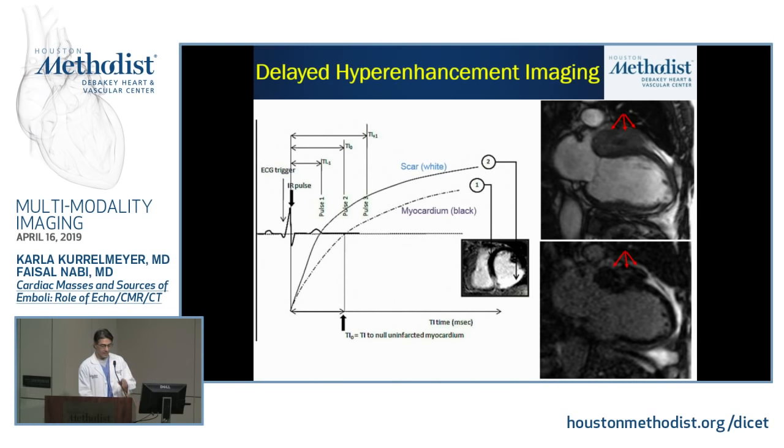And finally, the other probe that we use post-contrast for structural imaging is late gadolinium enhancement images. The concept here is that tumors will take up contrast. And this is going to be one of those serial points that I'm going to keep making throughout this talk.